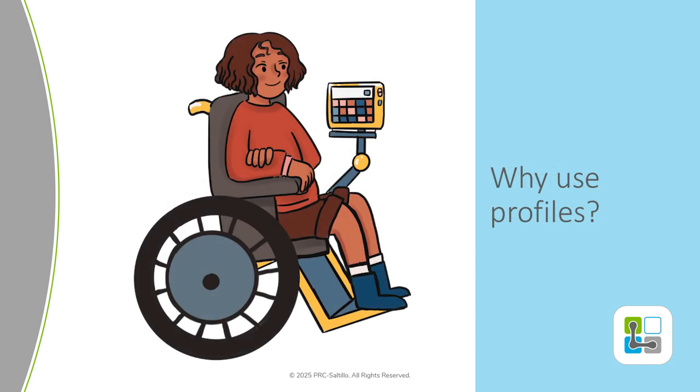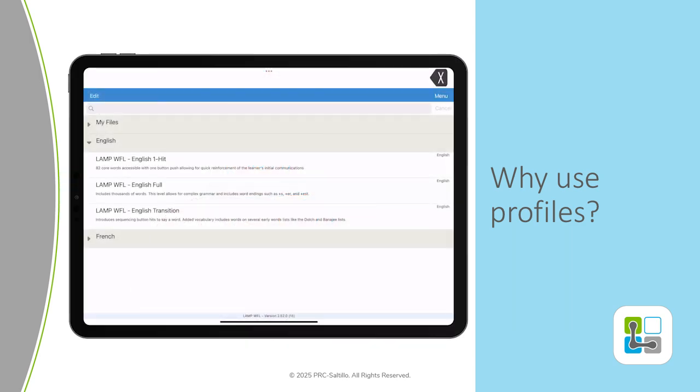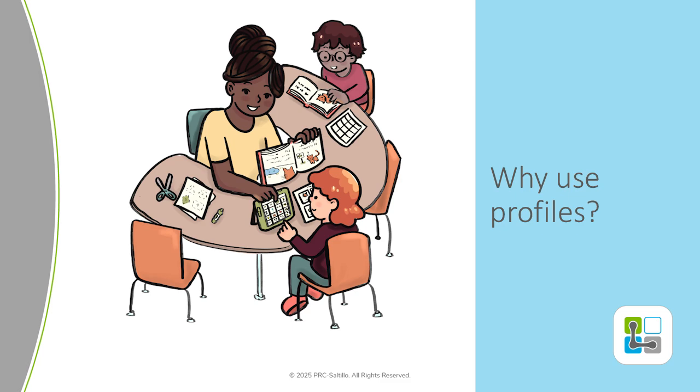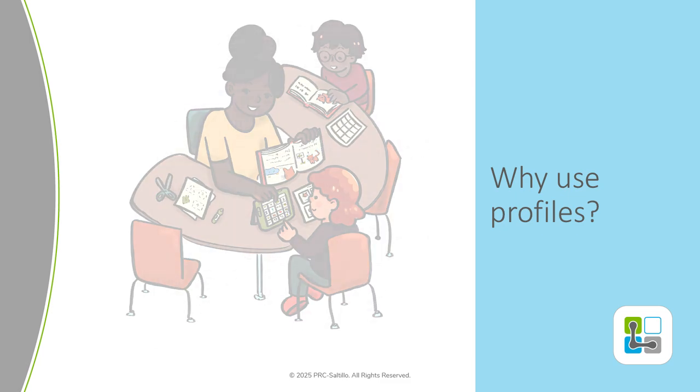There are several reasons why you might wish to create a profile. A few examples might be to adjust access settings throughout the day due to a client's fatigue, like going from touch access to head tracking. You could be transitioning between two different vocabulary file layouts, like LAMP Words for Life One Hit and LAMP Words for Life Full. Or a speech-language pathologist could be saving settings for multiple clients or students' files.